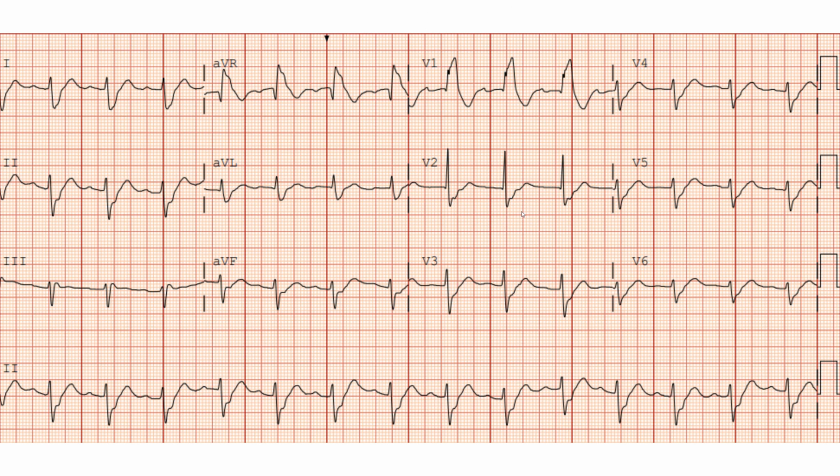Now, my contention why these QRSs look so odd is because there's a fractured QRS in here, which is, I think, subsequent to his valvular surgery. Remember, a fractured QRS is a delay or a blip in the QRS, and that's a sign of electricity going around something that's electrically inert. My contention is that it's his valve repair, but again, I can't confirm that.